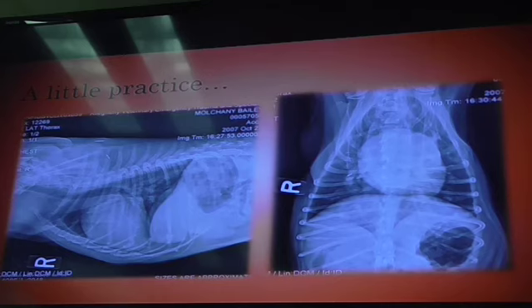Hold on, let's go to the computer. On the right side, she said? On both sides. The trachea? No, she's talking about the spine of the scapula. Yeah. Okay. So, spines of the scapula, here and here. If we follow from here, we're looking at the trachea. And then here is where it bifurcates, okay? And that's what you're seeing. There's certain areas, sometimes you can see, if I was able to play with the contrast and the levels, you can sometimes see it course upwards to the cranial lobes, just like that.